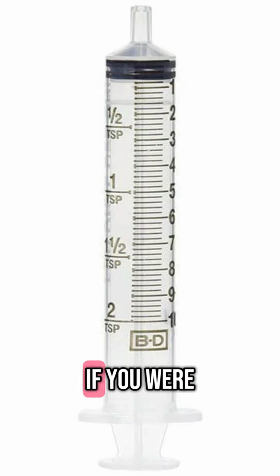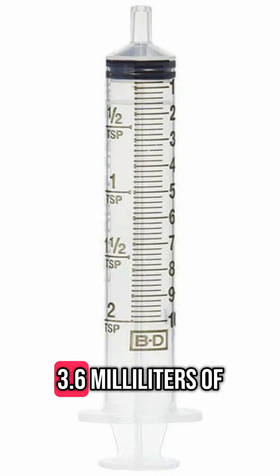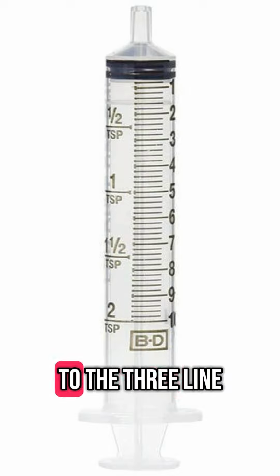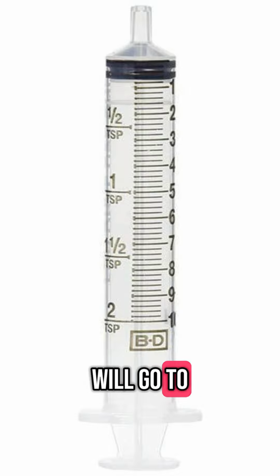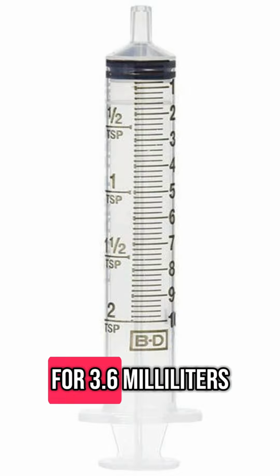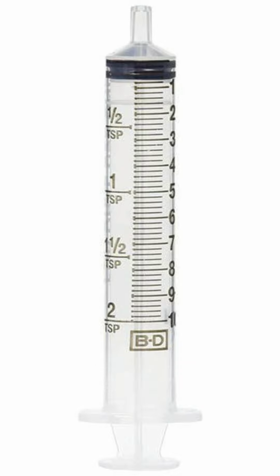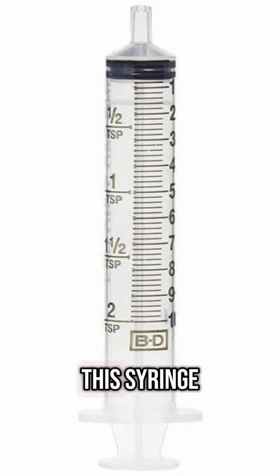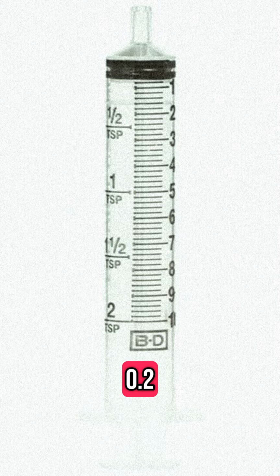So for instance, if you were to draw up 3.6 milliliters of a solution in this syringe, you would go to the 3 line and then go to the third line for 0.6 milliliters. And same thing if you were to draw up 8.2 milliliters of solution in this syringe, you would draw down to the 8 mark and go down to the first line, which will be 0.2.